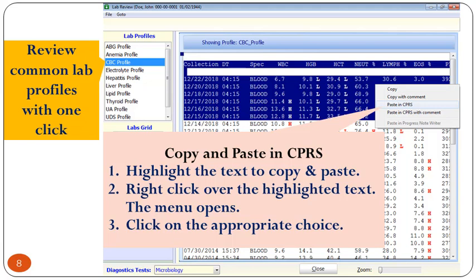Here is a reminder from Grandma. You must have a CPRS progress note, or addendum, open to paste the data. The data is pasted at the keyboard cursor position.